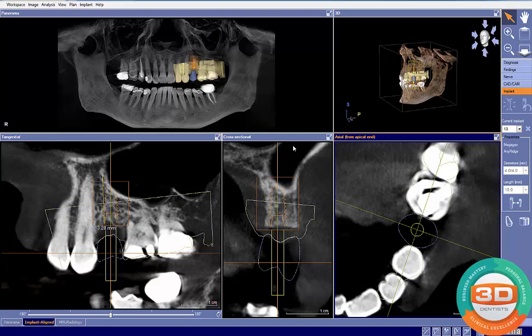Okay, so we've been sent a case. I don't have editing privileges as it was sent as a wrap and go. And we're looking at doing this case, or the dentist submitting it is looking at doing this case. So let's take a look and talk.